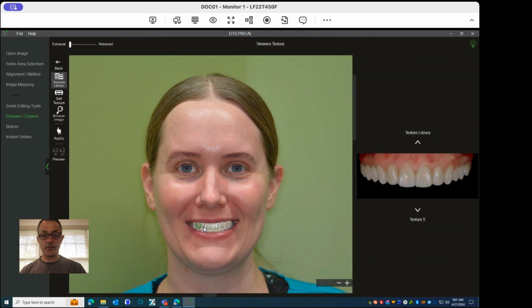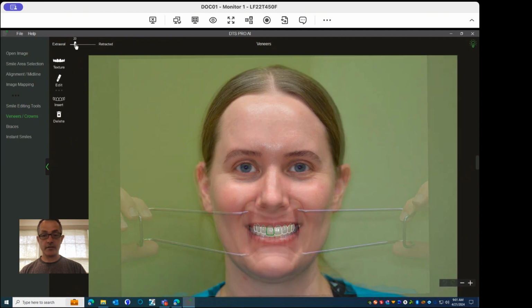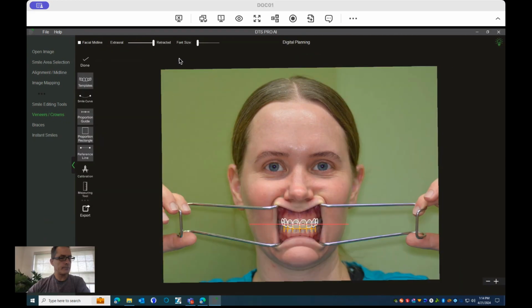And if we want to move teeth, you would just go back to the last window, Control A, and move them down a little bit, I think. Click apply, and there we go.